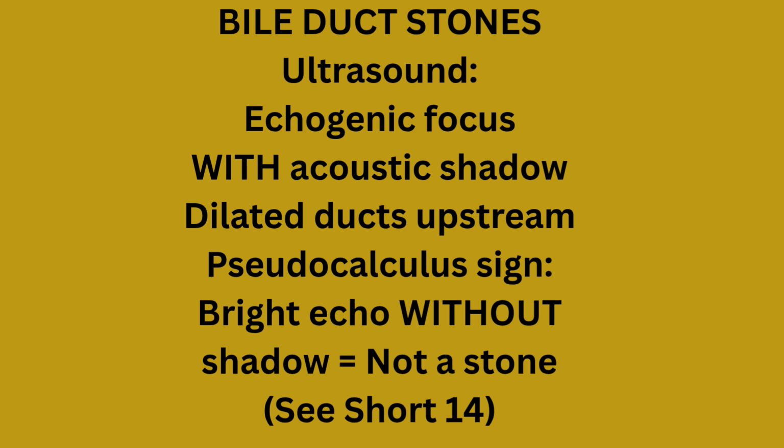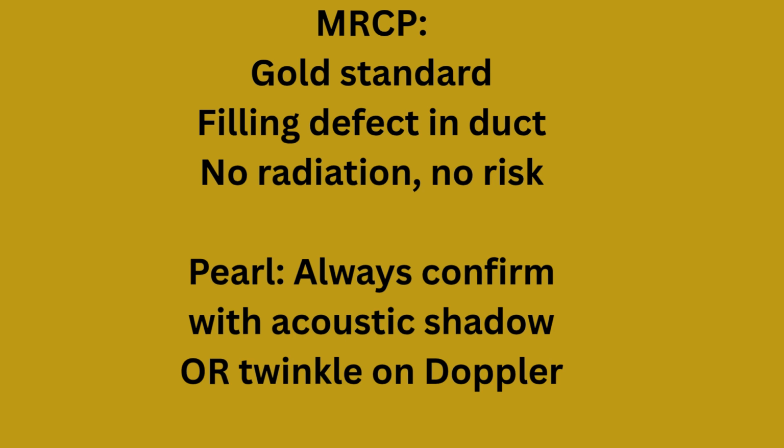Choledocholithiasis: echogenic focus with acoustic shadow on ultrasound, dilated ducts upstream. Always confirm with acoustic shadow or twinkle artifact on Doppler. Don't call a stone without shadowing. That's the pseudo-calculus sign trap. MRCP is the gold standard for confirmation. For detail, see Short 14.